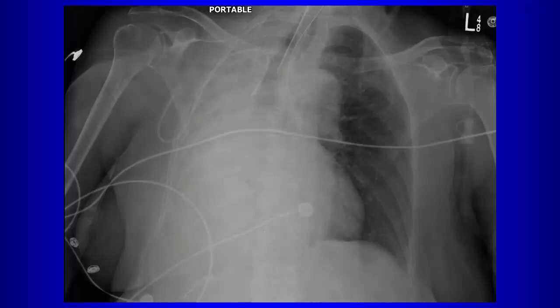We look for the mediastinum, the position of the mediastinum. If it's a large effusion, then the mediastinum will be shifted away. If it's complete collapse of the lung, then the mediastinum is shifted towards that side. So here we see that the heart is kind of shifted towards that side. So this looks like complete right lung collapse. So in that case, what do we think the cause is for this patient? So mucus plug would be the most likely explanation.